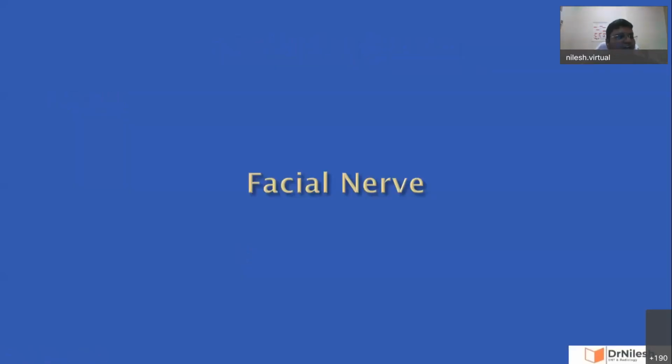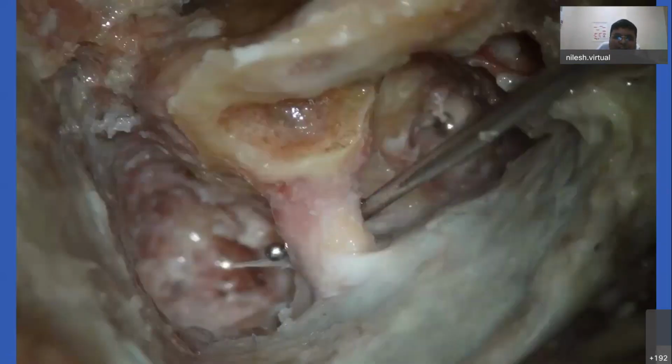So I saw in the chat box, most of the people were asking to again show the facial nerve, and before covering the facial nerve lesions, I will just explain once again the normal facial nerve. So today I'll explain a little bit differently. What I was telling you yesterday repeatedly: how to identify the internal auditory meatus.